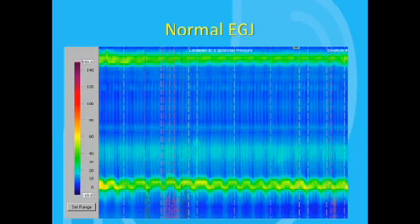In this slide, we see the section of the tracing that assesses the esophagogastric junction resting pressure. Traditionally, esophageal manometry has reported the resting lower esophageal sphincter pressure. We now know that there are many other factors that contribute to the barrier function of the esophagogastric junction besides the lower esophageal sphincter, and so that's why the total EGJ resting pressure is now reported in modern manometry.